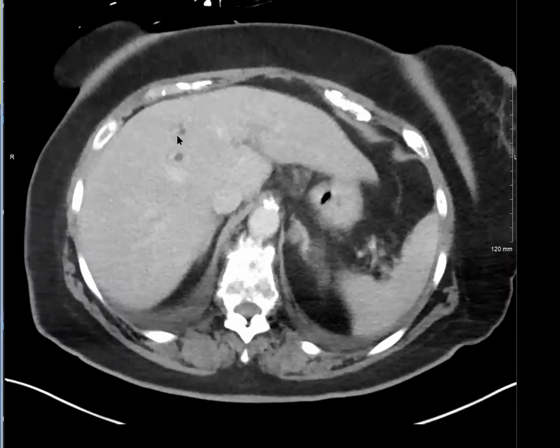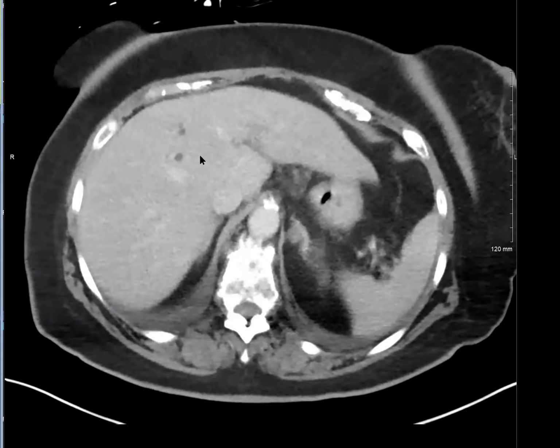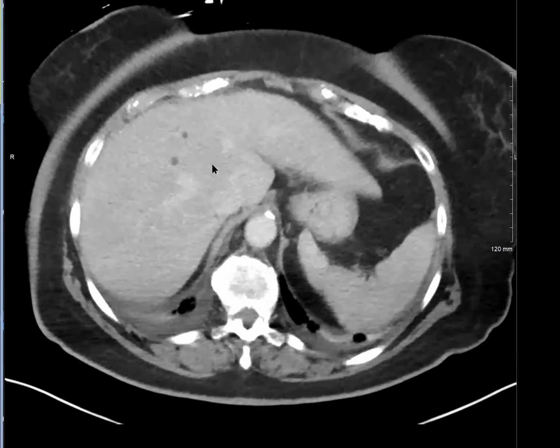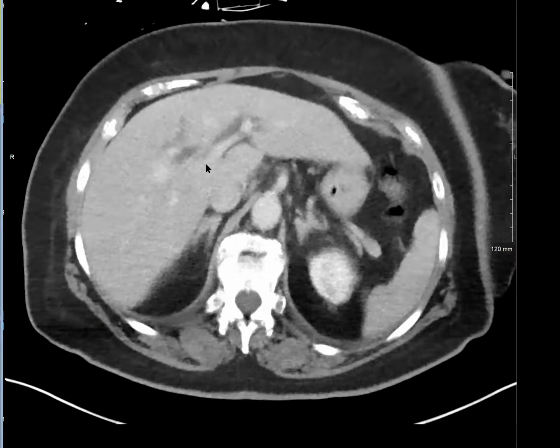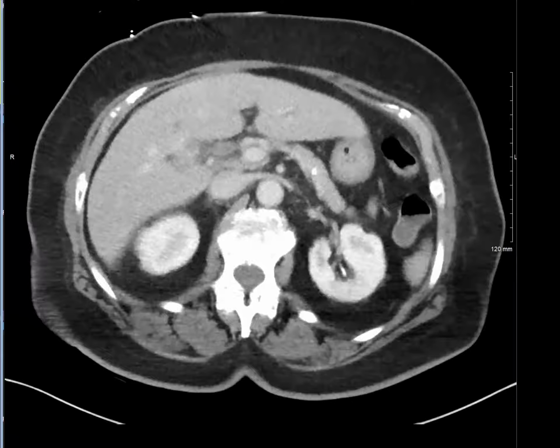And then is this like there is a component HCC invading the bile duct? Indeed. And then there is a component in the parenchyma that also washes out. There is no capsule, so to speak. So indeed, the biopsy report from pathology came back as HCC. Now, I want to show you.